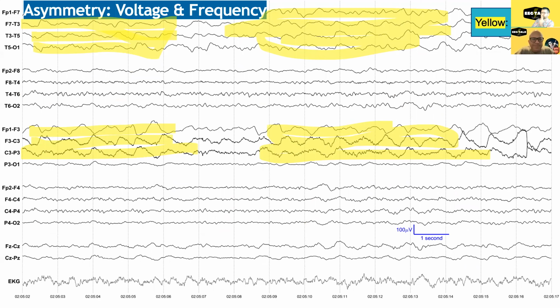You want to do this one? So what do you think here? So I think comparing left and right, it's pretty different. If you count, there's fewer waveforms in 1 second on the left side, so I think it's slower. Let's just do that together here. So 1, 2, really maybe 3. In the same region on the other side, we have 1, 2, 3, 4, 5, 6, 7-ish. So it's slower there. It's in the delta range because we learned that.